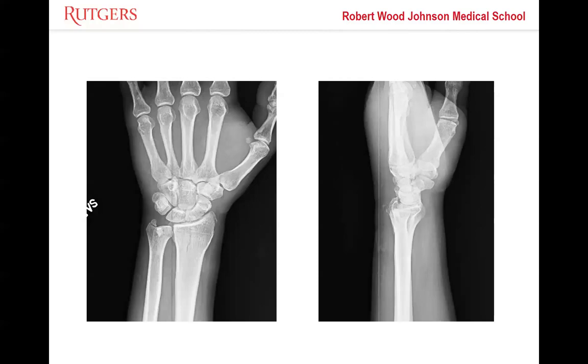Do you think there's articular displacement at the distal radius? Like when I saw it, like, what's this right here? And then it kind of drops off. Like, to me, that was a little bit concerning.